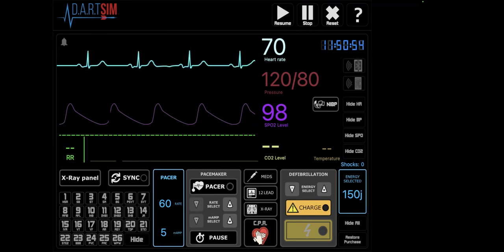So you can see that the pleth, or the waveform of the sat monitor, correlates with the ECG rhythm above. This is sometimes referred to as a poor man's art line, because when the artery has low blood flow, then you will see a change in this waveform.